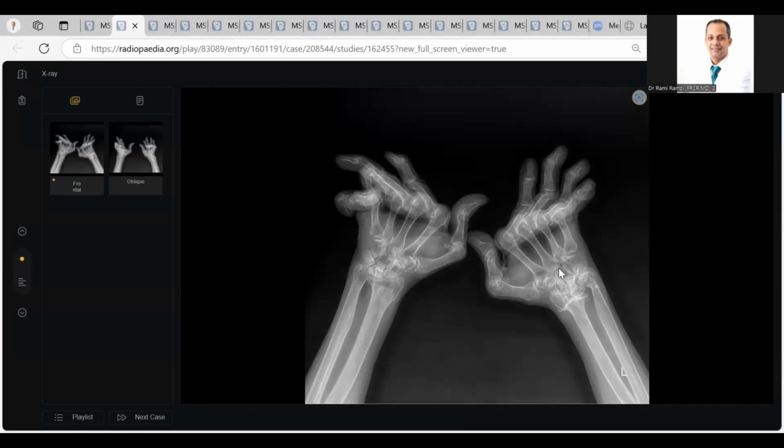Take care. I know this is acceptable in the beginning of our preparation, but take care to avoid it later. Even compare with the contralateral side. There is a wide difference. At least tell me I want another view to check what this is. There is a deformity. This does not look like the contralateral side. I suspect deformity versus fracture. At least I will not demarcate you. Okay.